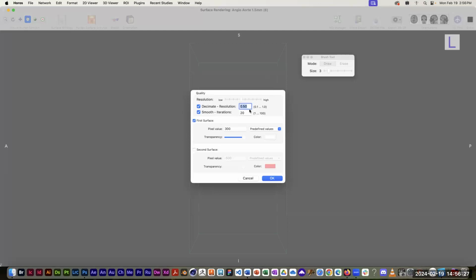So just like I do when I create any surface model, I need to choose a predefined value. I'm going to choose the predefined value of skin. The reason being, it's going to see the boundary between the solid black pixels on the outside, which is just like the hair, and then the white pixels inside the regions of interest, which it's going to interpret as an object.